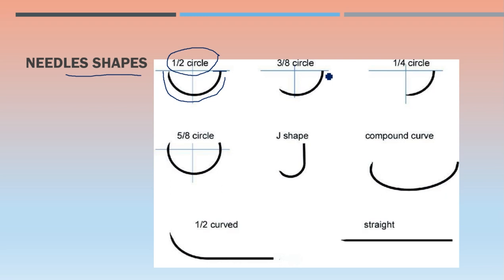Similarly, here we are dividing one quadrant into two, again two, similarly two, to total 8 parts. We have divided the circle into 8 equal parts. Now see, this shape is covering one part, then a second part, and then a third part, right? So that's why this is known as a 3 by 8 circle shape.